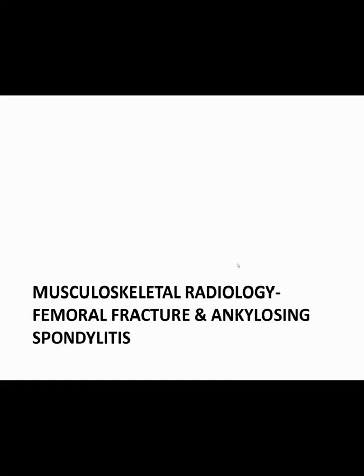This is a case of femoral fracture and ankylosing spondylitis. In this tutorial video, I will go through the vignette provided to you in the case module. I'll go through an approach to pelvic and knee radiographs. I will apply this approach to the images that were provided to you, and then we will go through the post-module quiz questions together.